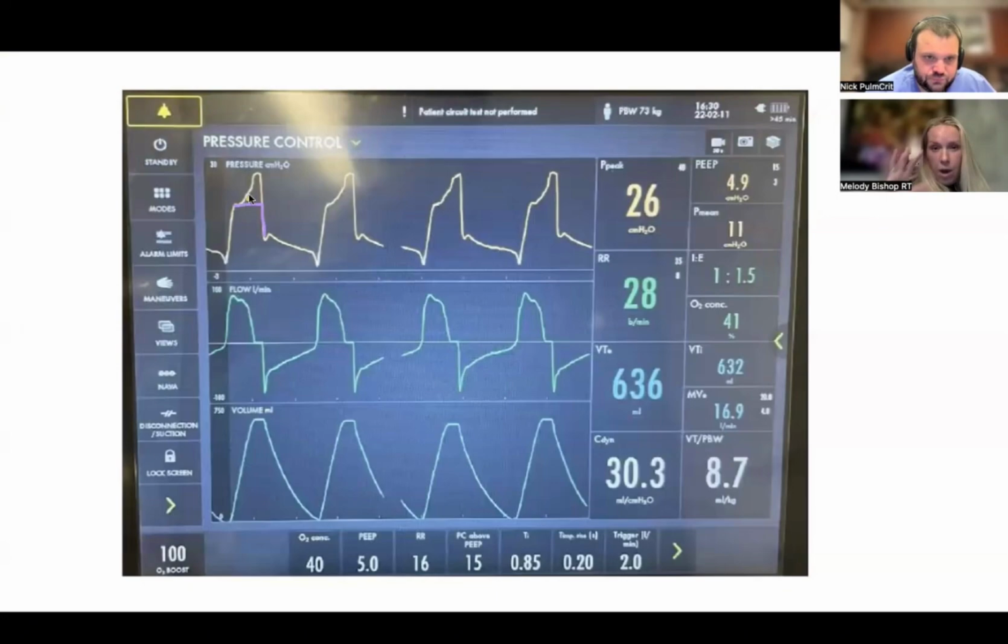And so right away, my eyes are like, oh no, this patient is working so hard that they have started to change the controlled variable of my vent. So this to me is ding ding warning warning warning. And just coming down to flow, because flow is normally where we're looking for patient effort. We can again see the same type of thing that we saw in the last one, that the waveform is not that nice logarithmic decay that we expect. We are seeing this kick up in the flow, that the flow is moving the opposite way, and thinking of the fact that the patient is maintaining high flows all the way through inspiration and still pulling, and we're not seeing this slowing down that we should see with a correcting pressure gradient in pressure control.